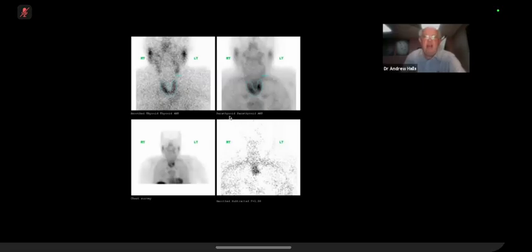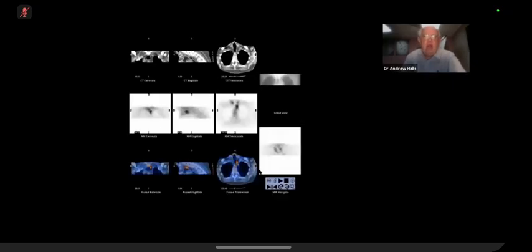That's, again, another thyroid pertechnetate, SESTAMIBI, take one away from the other, and you get the site of the parathyroid adenoma. And we have here got it on the SPECT CT images where the parathyroid adenoma is. And the idea of this is it makes it easier for the surgeons.